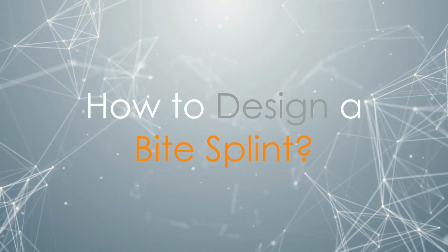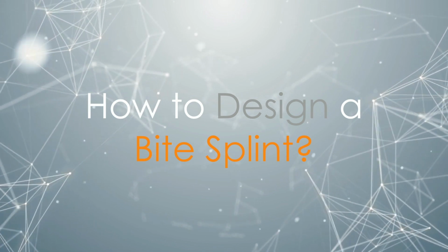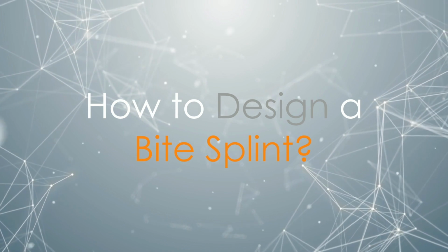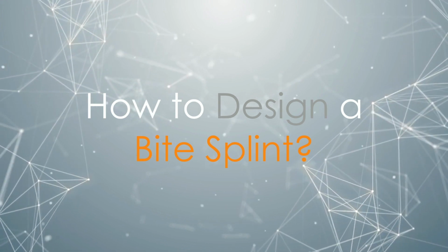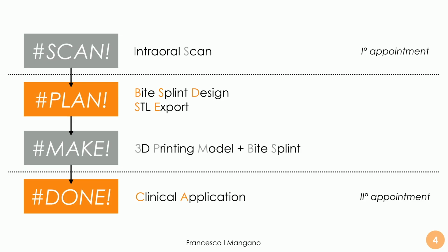And let's go to the bite splint in particular and how to design a bite splint in a modern way, because we have several options, of course, but today we have also the material and the printer to print bite splints directly, and they work very well. So how do we proceed in this case? We take an intraoral scan of our patient, and this is the first appointment. Then in the second appointment, we can immediately deliver our bite splint.